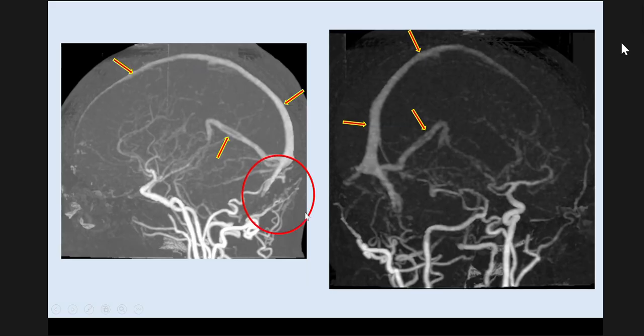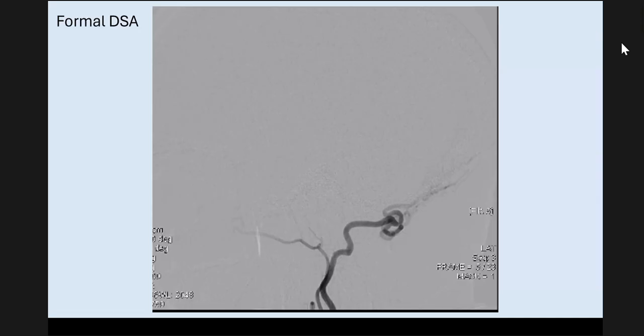There you go. So in the occipital region, you see this conglomeration of abnormal looking vessels. And you see the occipital artery is dilated. There are some branches which are quite dilated, some draining veins which are tortuous, dilated, and there is this conglomeration of vessels based along the dura. That's where you would expect the dura along the occipital bone.